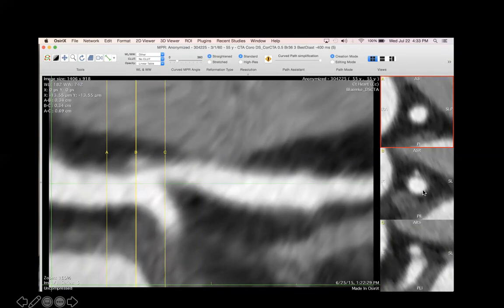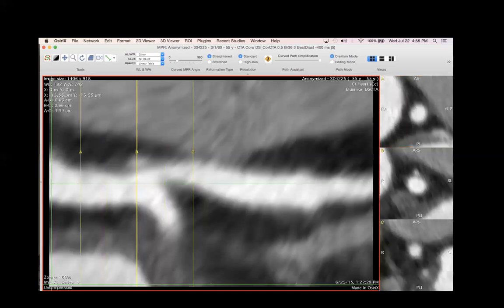And so this is called a stenosis. It's not a hugely serious stenosis. It's about 50%, and you wouldn't do anything about this. You're not going to put a stent in here to widen this out. For one thing, you're right at a junction, which is a difficult place to put a stent accurately without messing things up. So, you can, in 3D, march through these vessels and look at their dimensions with great accuracy.